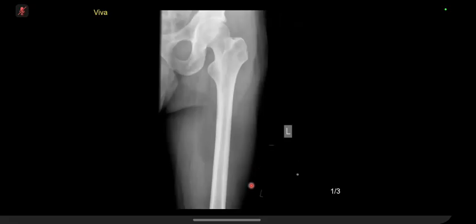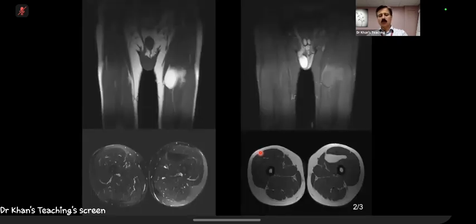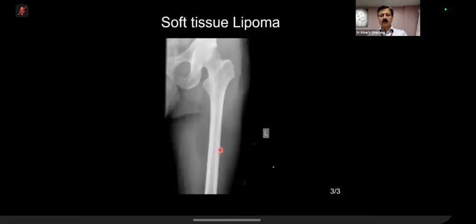Because it seems to be increasing the transmission of the X-rays, it must be less dense than normal soft tissue, so potentially either a large cyst or a lipoma. Oh no, sorry, just a lipoma. Lipoma, its low density means it has to be less than soft tissue. So on an MR, this was confirmed. If you see here, and it saturates here.